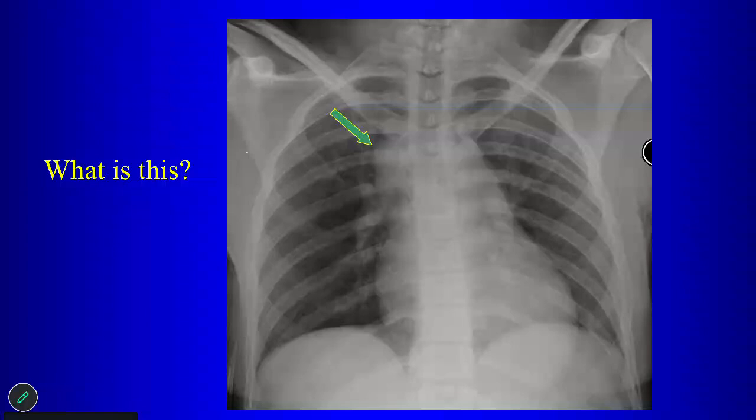A mass. Well, mass mostly is lymphadenopathy. What kind of mass are you talking about? You talking about a benign lesion? What benign lesion might do that? Anybody? Duplication cyst? Possibly a bronchogenic cyst, although the most common location of a bronchogenic cyst is where? Subcarinal, right. But they might occur in the right paratracheal region.